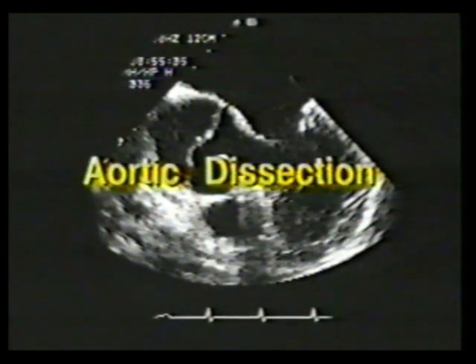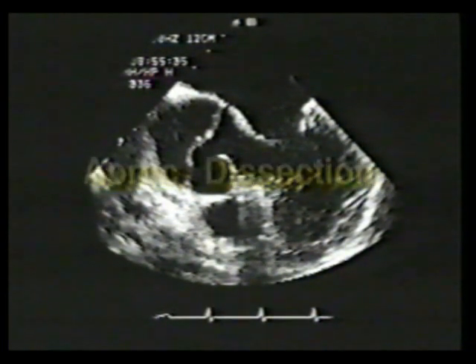Aortic dissection is a life-threatening condition which has a large variety of clinical presentations. Accurate and prompt diagnosis is essential. We believe that echocardiography is the diagnostic modality of choice for most cases of aortic dissection.